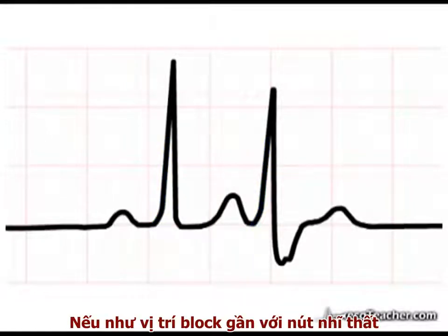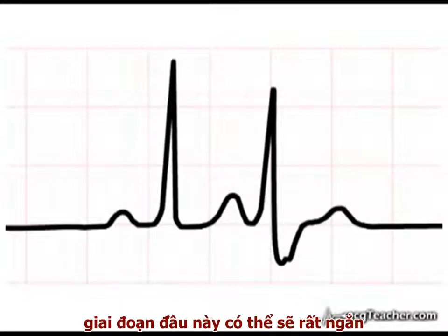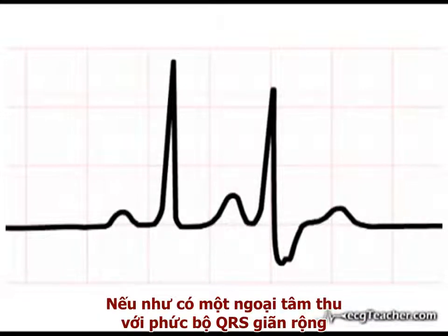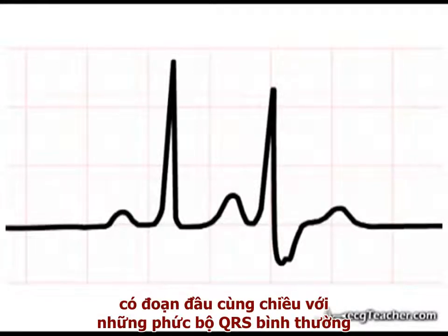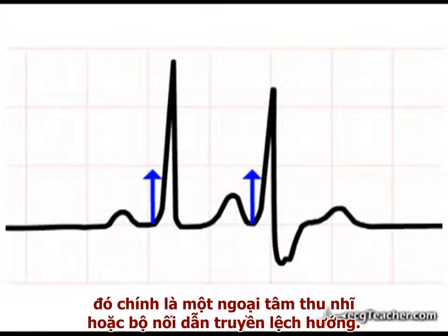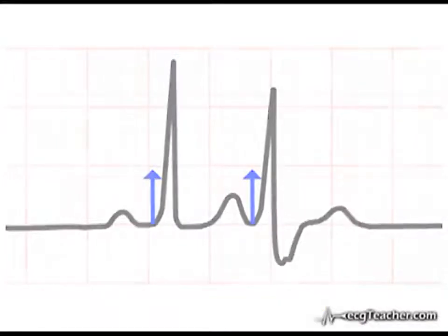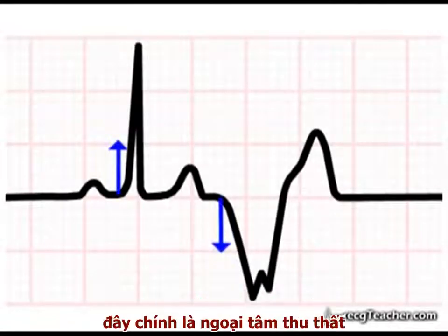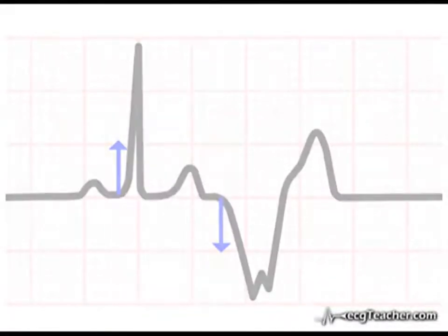If the block is close to the AV node, this initial period can be very short. In practice, if a wide premature QRS complex is initiated in the same direction as the normal complexes, and this is observed in several leads, it is likely to represent an aberrantly conducted premature atrial or junctional contraction. If the complex is initiated in the opposite direction, it is likely to represent a premature ventricular contraction.